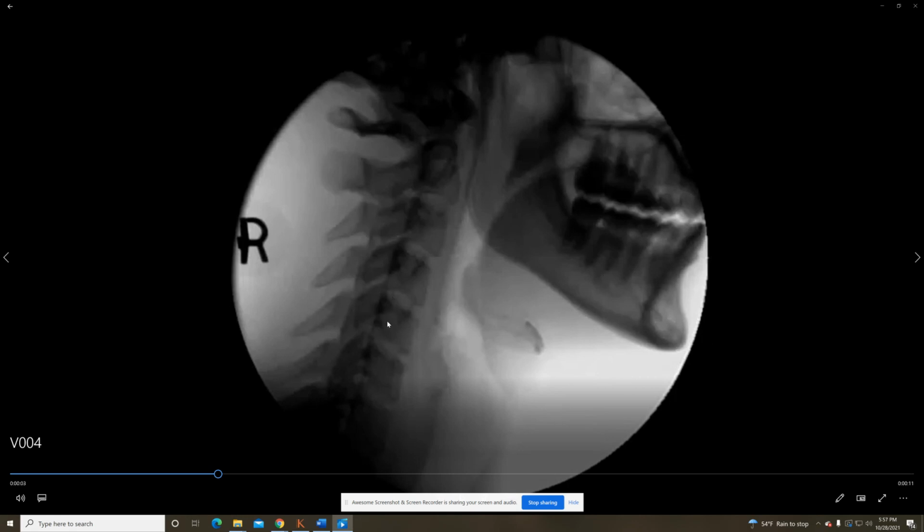A couple things we're noticing. Disc spaces, we're comparing and looking at them. We can see that back in here, it looks like we've got a little bit more bone growth. You can see there's less space than there is up here. Also right here, less space, less space. You can see there's no curve. It should be curving this way. If anything, it's slanting or maybe going a little bit forward. But again, if we didn't have any motion, that's about where we'd end.